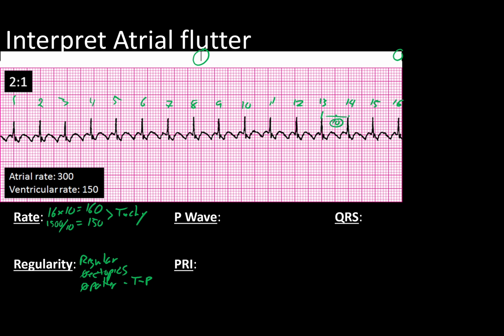So you have an upright QRS that points this way. What follows a QRS? Well, it should be a T wave. And so if this is a T wave pointing upright, and then there's this downslope, and then something comes up again, that thing that's coming up surely should be the P wave, correct? Well, that P wave is so close to the QRS, in fact, it just kind of cycles through. And that's that hallmark, that sawtooth, that no matter how fast the rhythm's going, you can still imagine that traveling underneath everything.